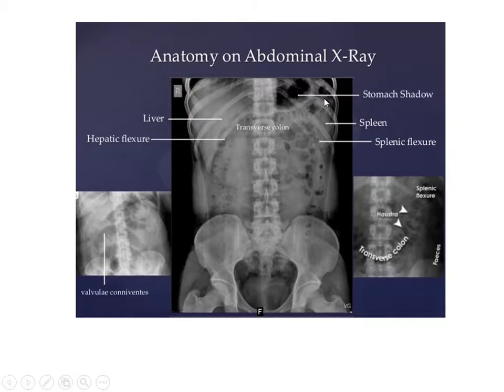You can see the spleen here. Between the left hemidiaphragm or the left lung and the adjacent colonic and gastric gases, you can have a rough idea about the size of the spleen, which should not be more than 14 centimeters in any dimension.